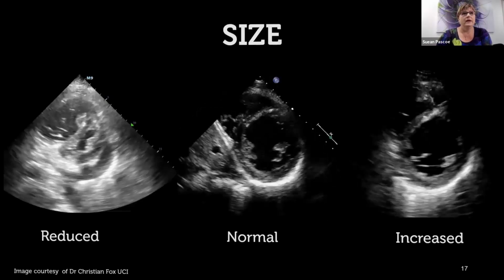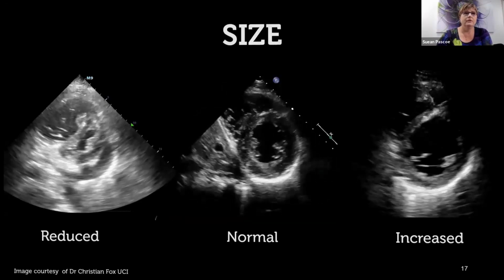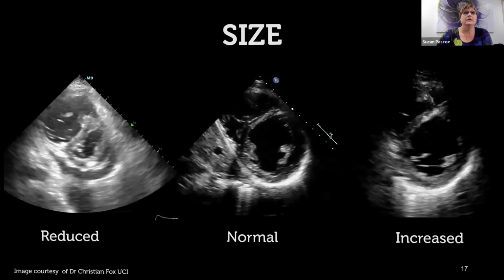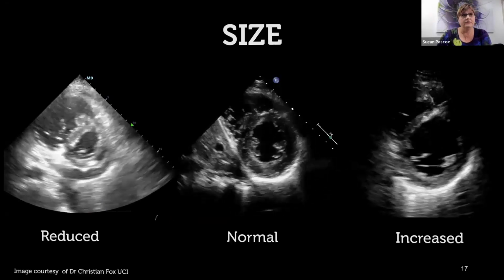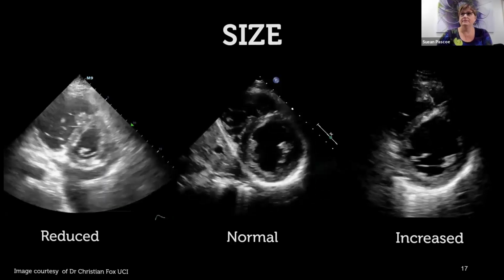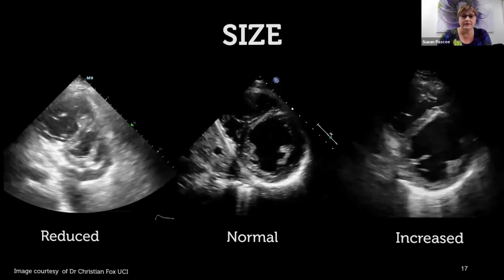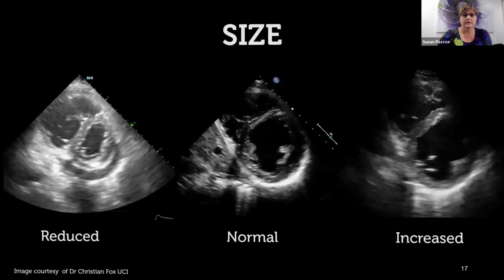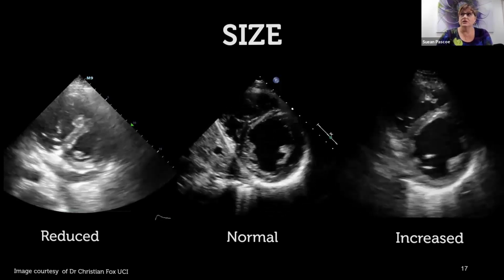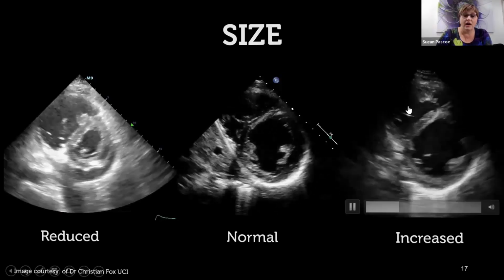So if we look at the size, you can see here normal in the middle. Now if we look at the size, you can see the left ventricular cavity is quite reduced in this image on the left and quite enlarged in this image on the right. As well as an enlarged left ventricle, on this increased one we also have an enlarged right ventricle.